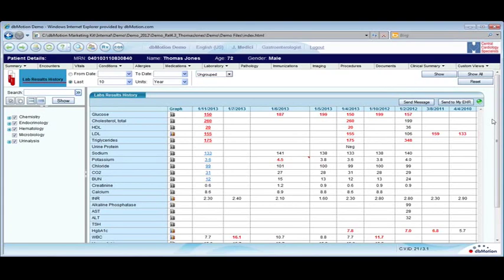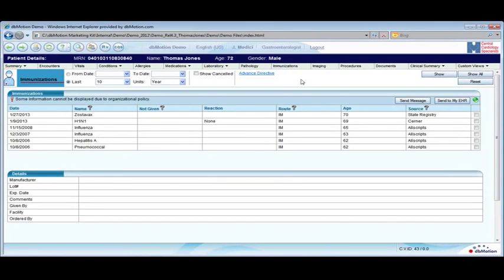And when we go back again to that EHR agent that I showed in the beginning, the workflow hopefully will be clear to everybody. And I know I'm jumping around a lot of different places here. Real briefly, and again, my intent wasn't to go into every domain. I will point out some places, I'm lucky enough in Western Pennsylvania that the state registry is bidirectionally feeding and consuming data from DB Motion.